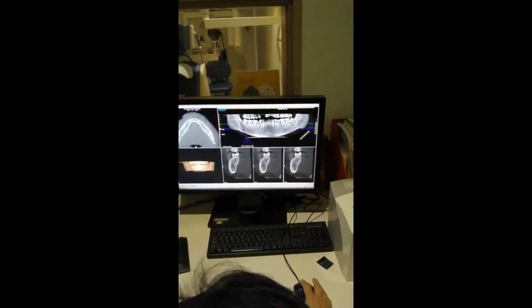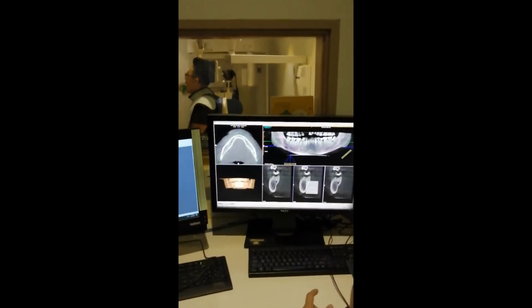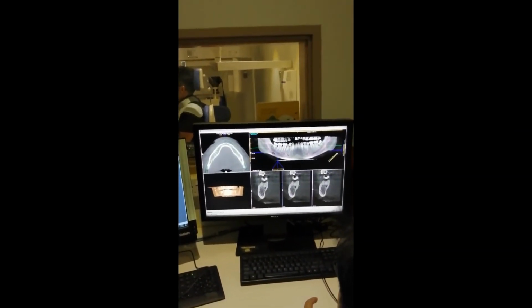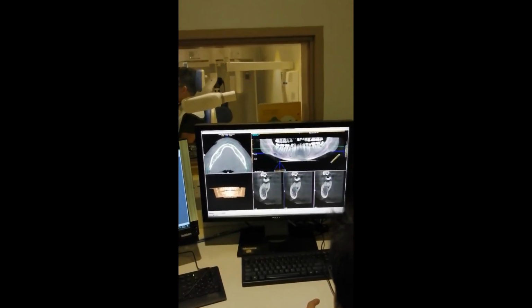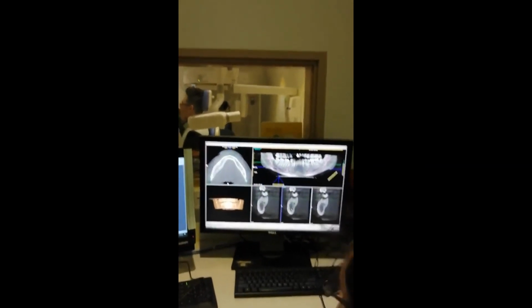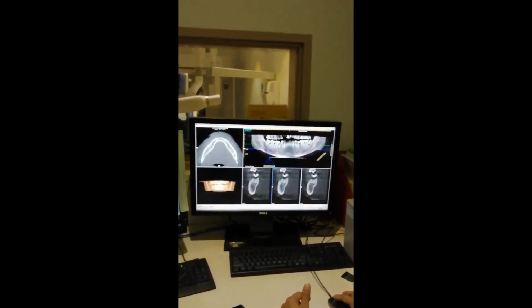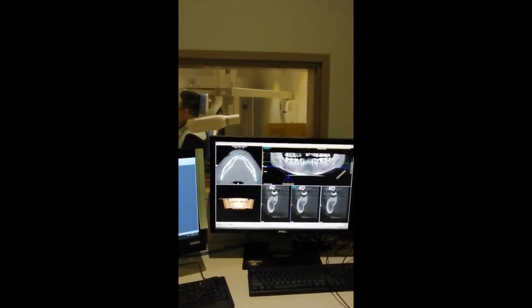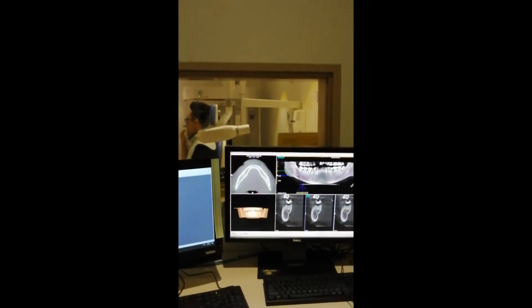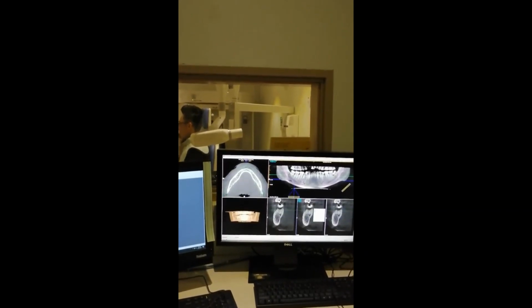See, wherever you want to place, the canal is there. Now if you want to place here, yeah, just distance. Okay, let me check how much is available. Okay, usually we give 2 mm space, safe zone. Okay, so it is coming 16.65, and whichever area you want to measure, you can measure. Okay, yeah.